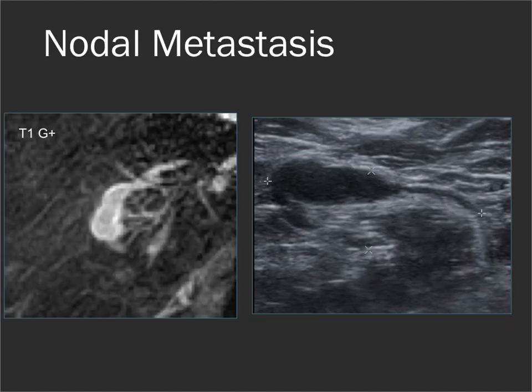One of the things that concerns us is if we have thickening of part of the node, but not another part of the cortex. And you can see here the MR and the ultrasound correlate very nicely in this patient. So this was probably about 6 millimeters thick here. This is normal cortex. Obviously, when you biopsy this patient, you want to be biopsying through that thickened area, not the thin area.